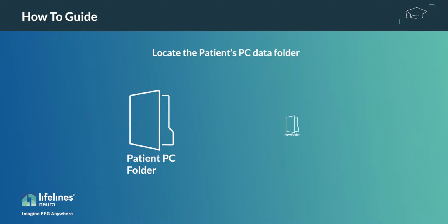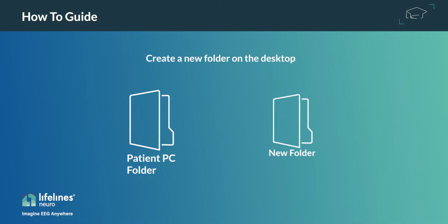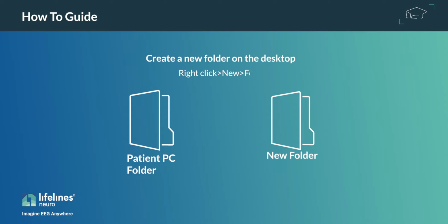Then, create a new folder on the desktop or external hard drive for your patient. You can right-click and select New and then Folder to do this. We recommend using a folder name in accordance with your lab's protocol.